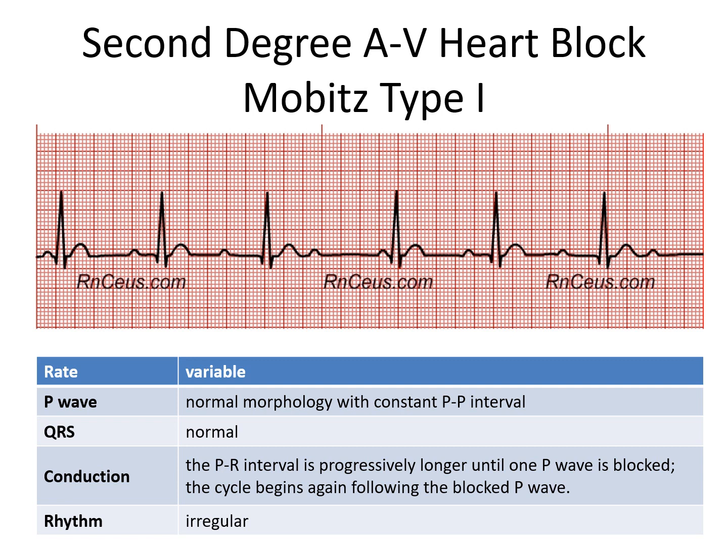We love to discover this. Nurses get very excited when they've got a patient who's got Wenckebach, because what they get to show you is that the PR intervals become increasingly longer in this rhythm strip, until finally one of the P waves is blocked from being conducted, and that impulse is not completely conducted. Okay, so the P is blocked from occurring.